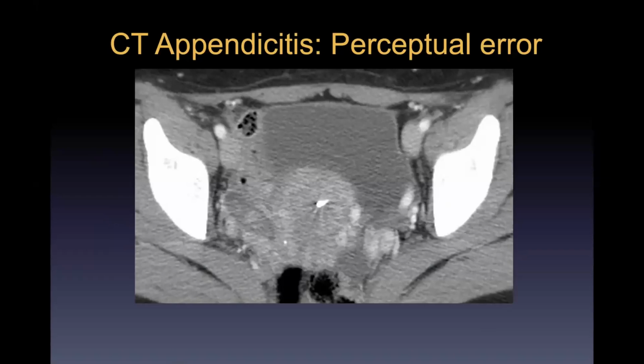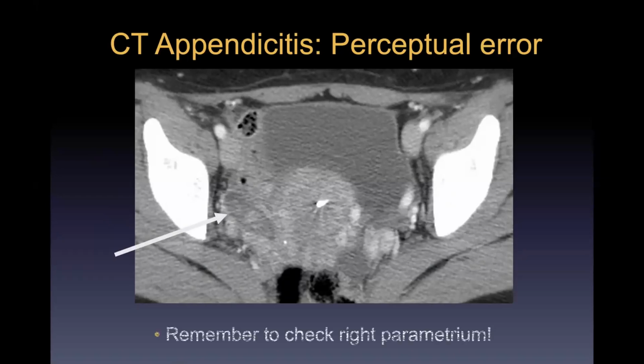It does happen. Does anyone see the appendix here? I like to pull people when they're in person. It's a little more difficult over Zoom, but I will reveal it right there. This tubular fluid-filled structure in the right adnexa. This was a missed appendicitis.